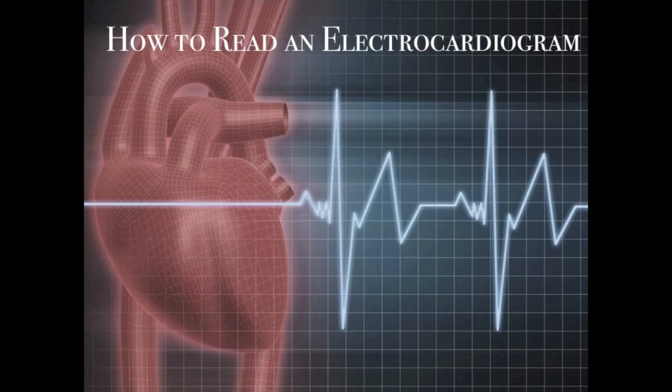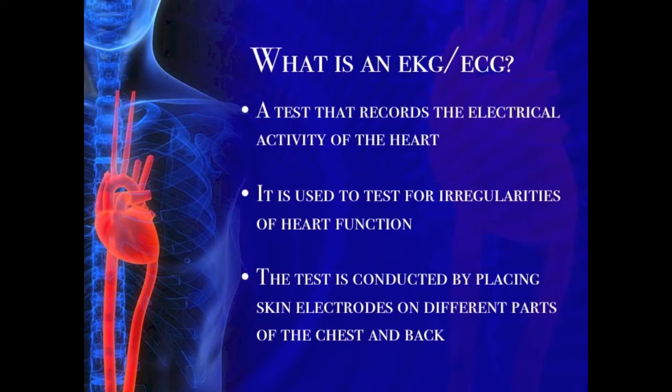The goal of this video is to teach you to read an electrocardiogram, or for short, ECG or EKG. First, what is an ECG? It is a test that records the electrical activity of the heart. The ECG is used to test for irregularities of heart function and detect changes in the electrical activity over time.